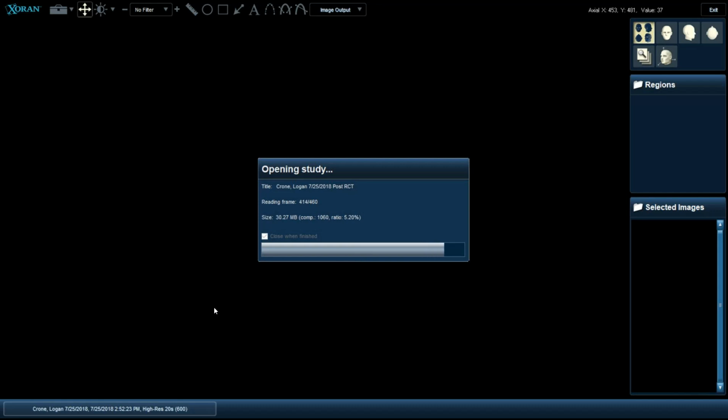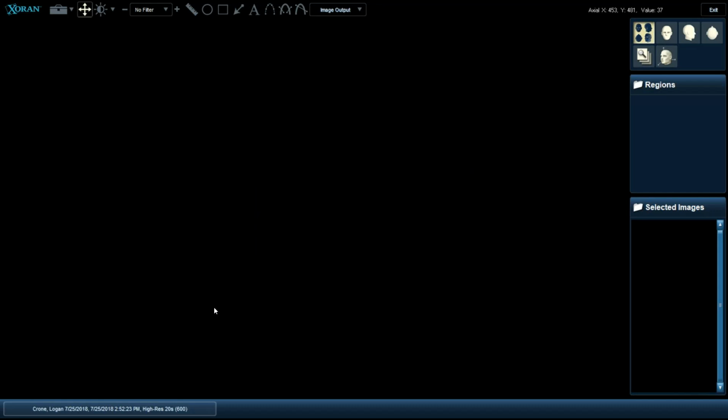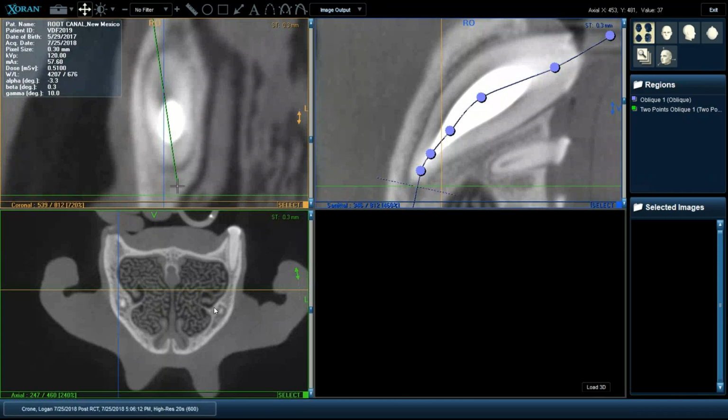The VetCAT can stay connected somewhere else in the area in your room. It works on batteries. You can just grab it from a corner and bring it back.